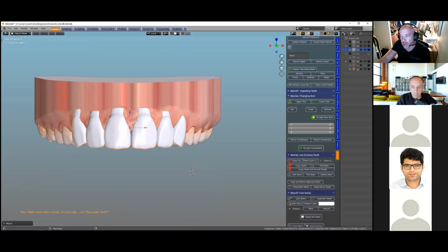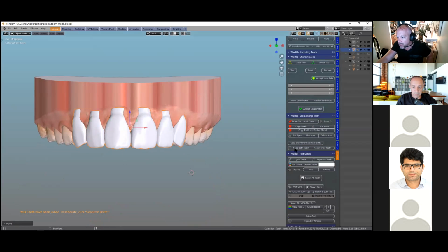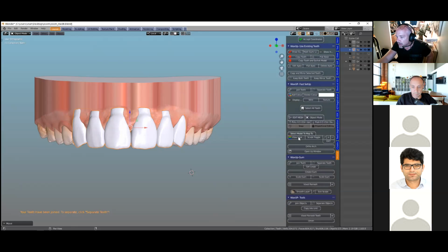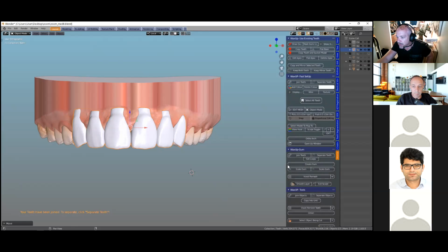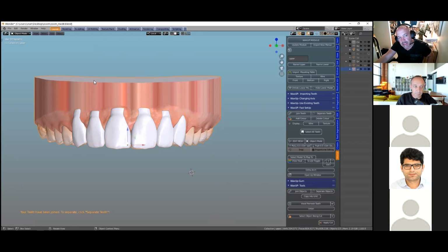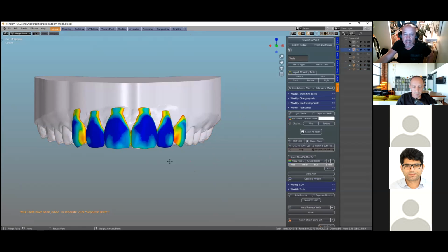And then in our setup, sorry, I've just got to find this. I'll just close everything else down so we don't get confused. So in the file setup, we can then heat map. I'm going to select the back, and this is going to be the model which I want to map to. And this one then, I will click on View Heat Map.